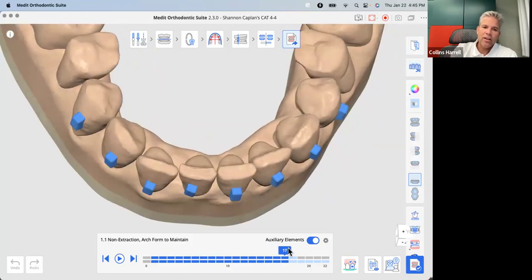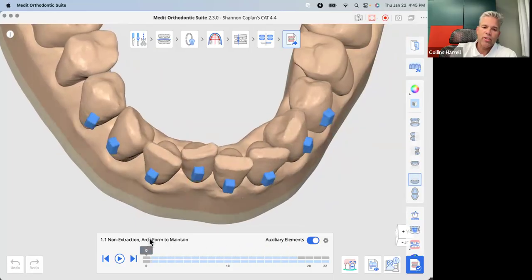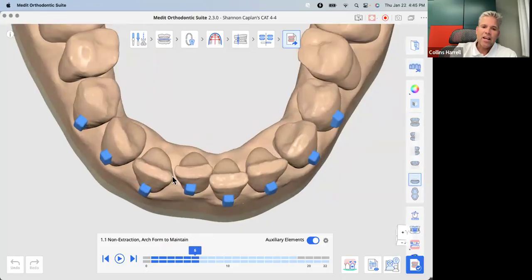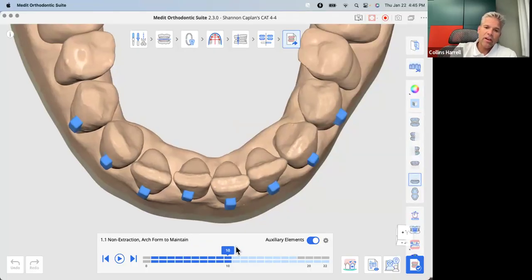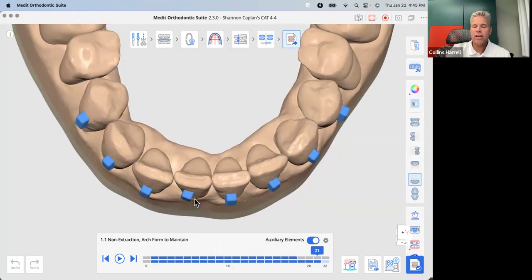This is one of the reasons why with Medit aligners, it's programmed to open up more spaces between the teeth before it starts rotating. It's to compensate for the fact that it's invented those interproximal surfaces. And that's where a lot of our aligner cases don't actually work the way we want them to, because these little collisions in between interproximal are coming from the fact that it's computer generated tooth anatomy.